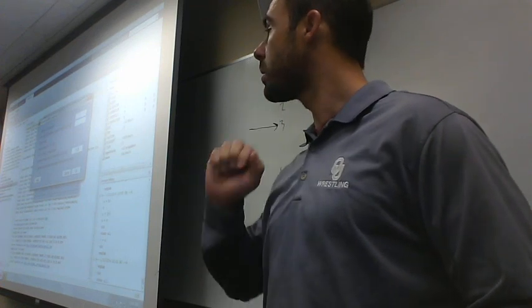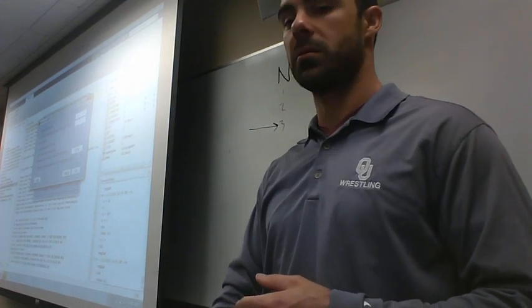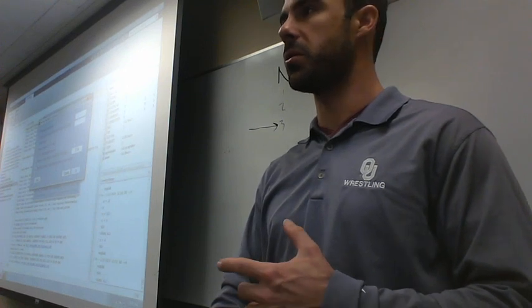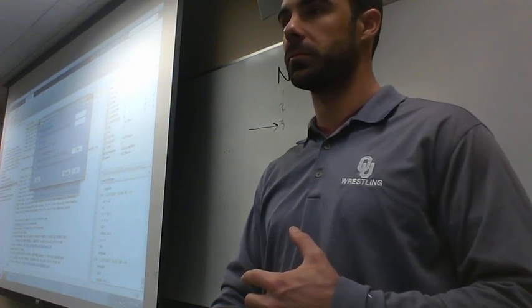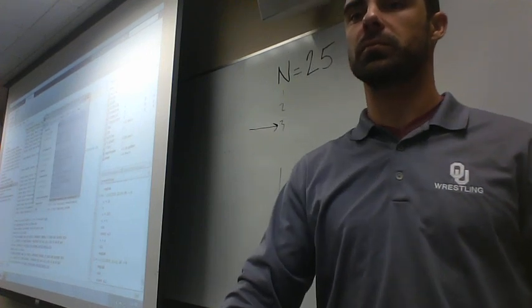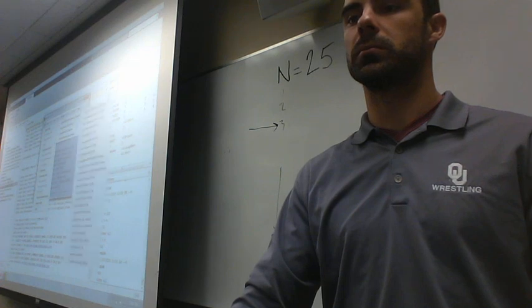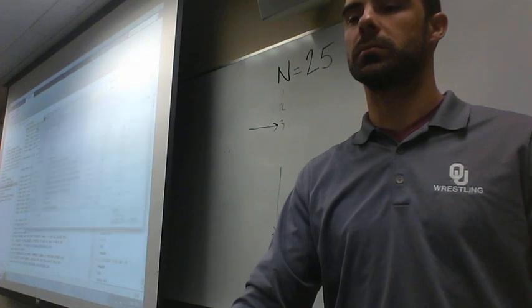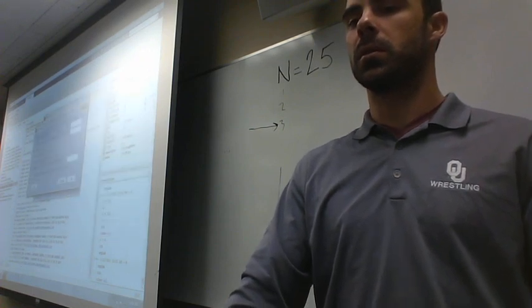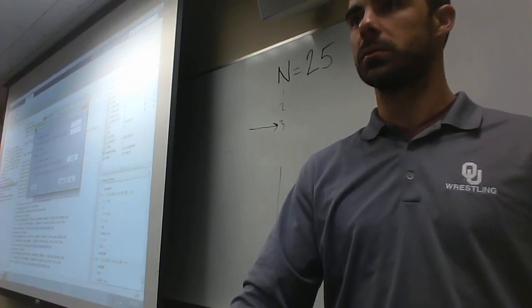Yes? I don't have the same box. Did you do what we did? Okay, Ariel, do you think you could help her? Mine is different too. Okay, so you need to import data. So you could speak it, right? Is that what you did? Right, so that's what you do.